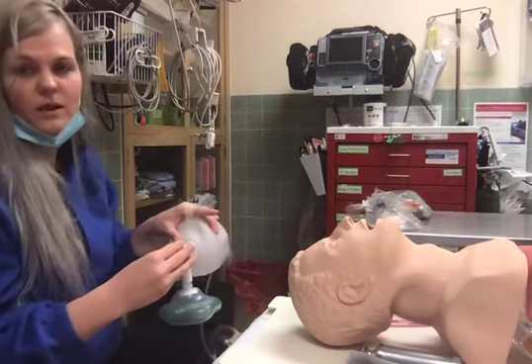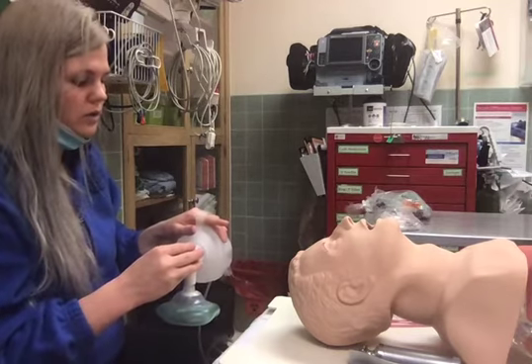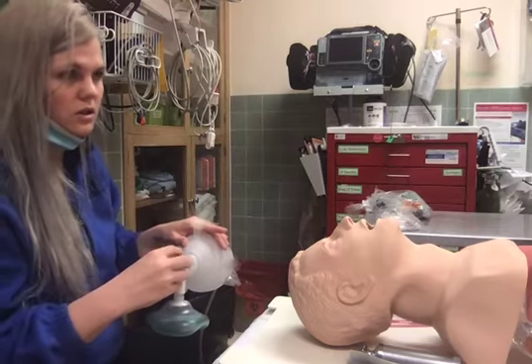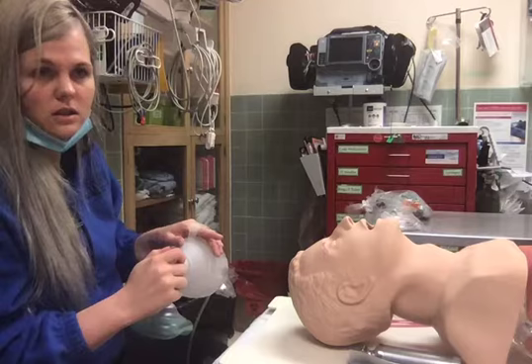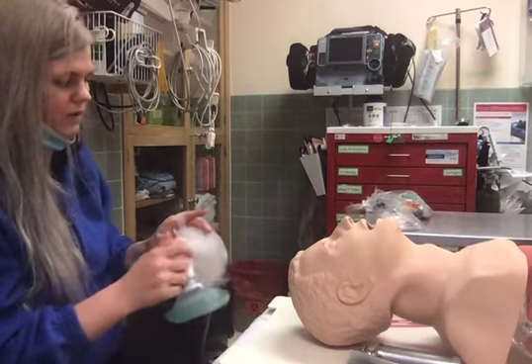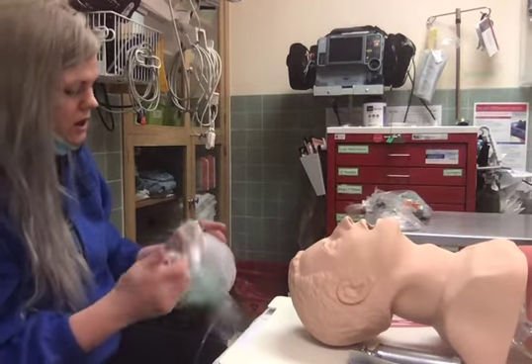But you could also add a PEEP valve to these, which is incredibly helpful when you start bagging patients. When you let go, you're essentially losing all your alveolar recruitment, which in turn makes the entire process so much harder. This does not have a PEEP valve on it, but I did want to make sure that I made reference to it in this presentation.